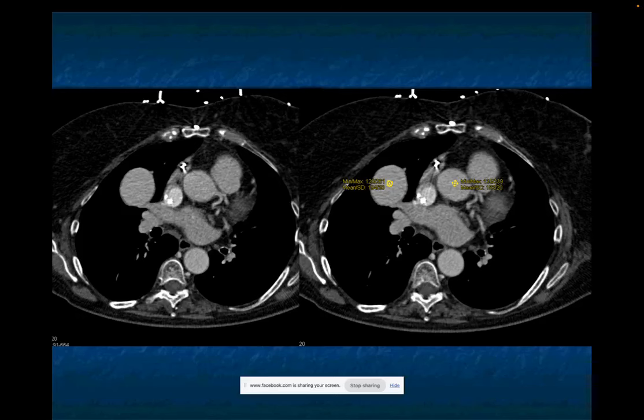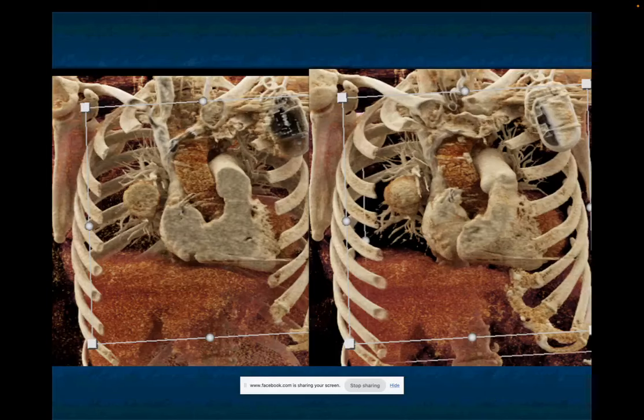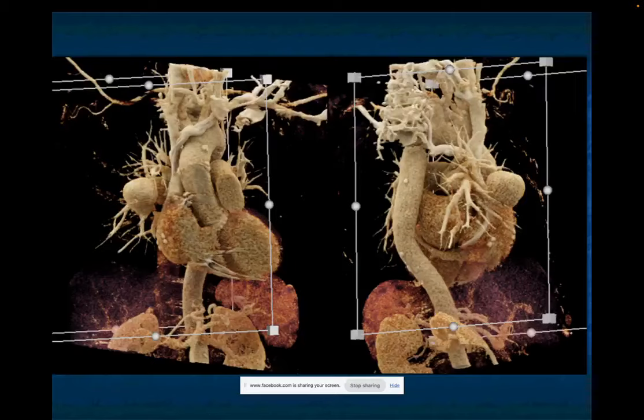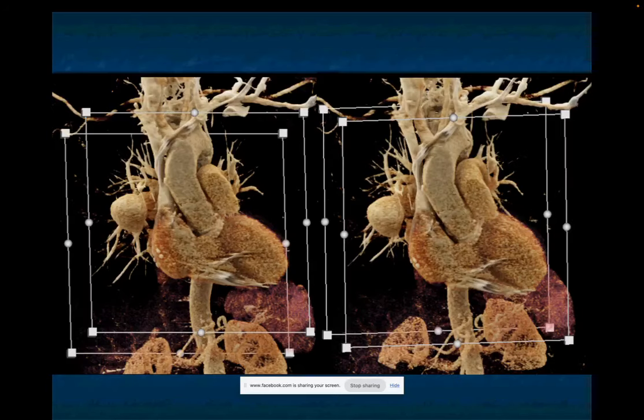And this was a large aneurysm, another wonderful example of a pulmonary artery aneurysm, really nicely shown on the cinematic rendering. Here it is with SVC shown to right atrium, and a really nice example from different perspectives of the patient's pulmonary artery aneurysm. Just a really nice example. And we don't see many of those.